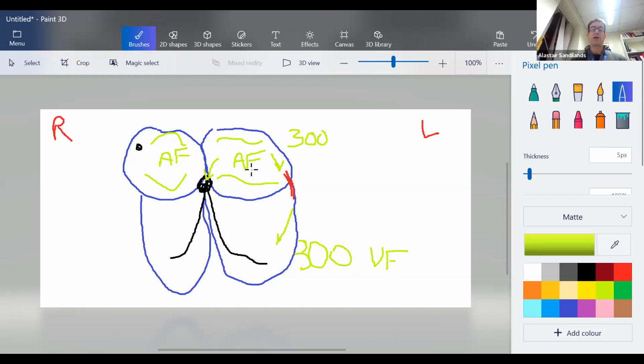So we see atrial fibrillation going down the pathway into the ventricles, making the ventricles go very fast and risking VF. But now you have a delta wave because it's going forwards, but you have an irregular rhythm. It's very irregular and fast. But there's evidence of the delta wave all the time in that part there, delta wave, delta wave. So you see a signal of the delta wave because the atrial fibrillation is going down forwards over the pathway. I hope that answers it for everyone.